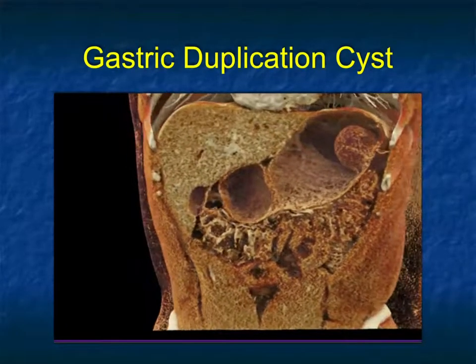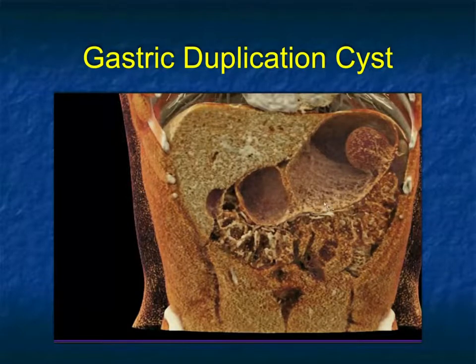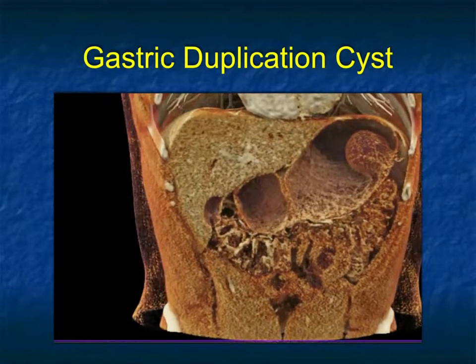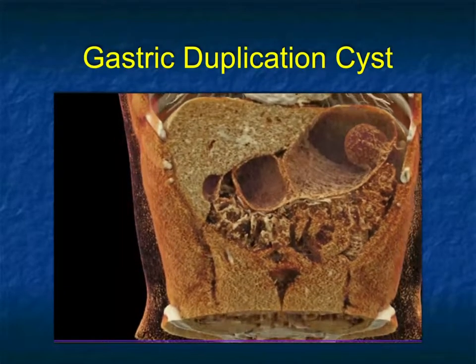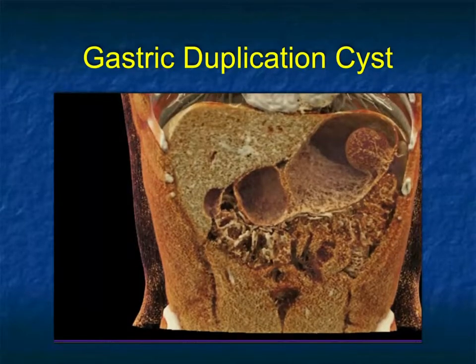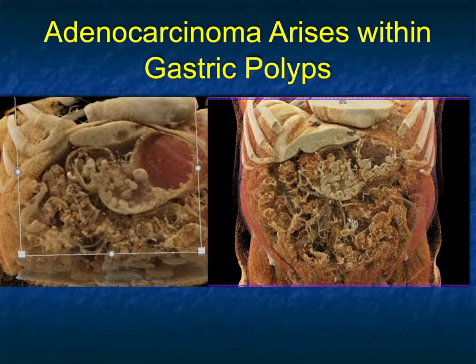So to me, we always talk about how it's hard to pick up subtle gastric cancers because of ulcerations and surface lesions. Well, perhaps this is going to be the way to do it by accentuating the gastric folds and being able to look inside the stomach rather than looking at secondary projections. So I think that's going to be very exciting.